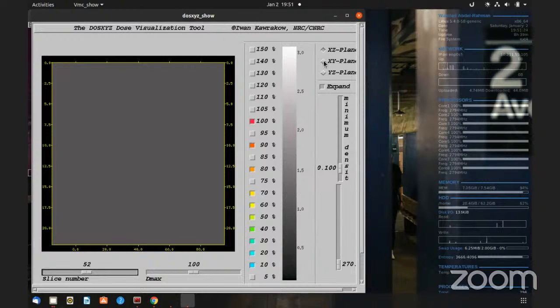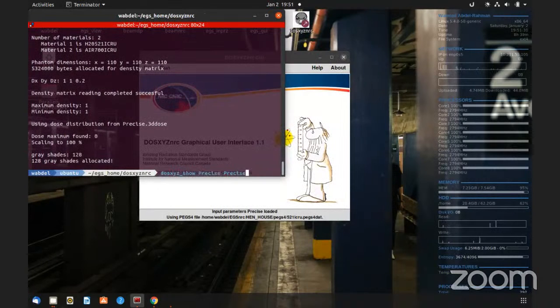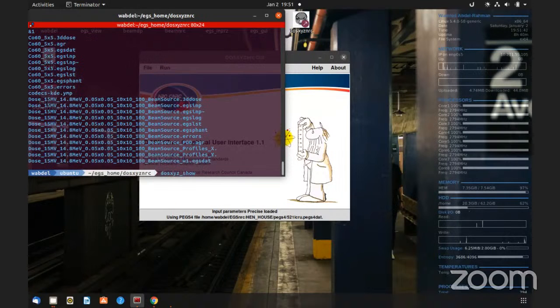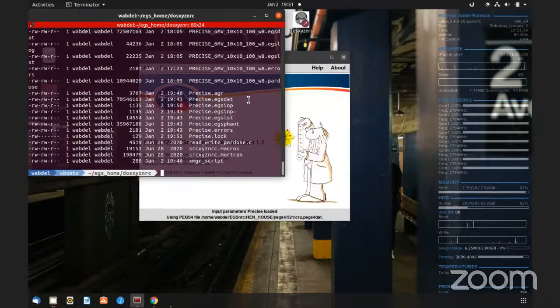Okay, I have a problem. There is something I don't get. I really don't know what's going on, but let me show you what I have done. Maybe that's why.